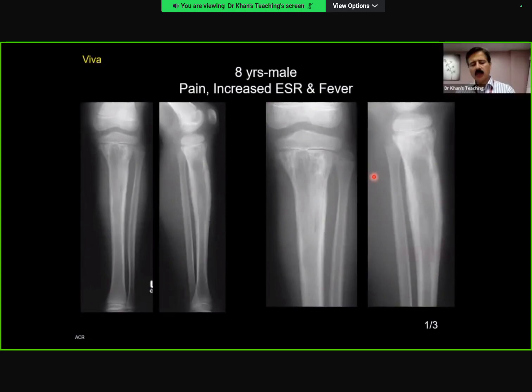I stop you here. So the take-home point is, I've shown you MRs in infections also. MR is the correct answer. You will ask for an MR because MR can at times differentiate between the two, infection versus a tumor. Please also remember that the main differential is infection versus Ewing's. Ewing's is the king tumor. FRCR, always consider Ewing's up there.